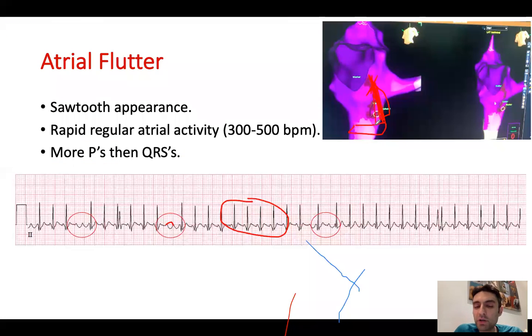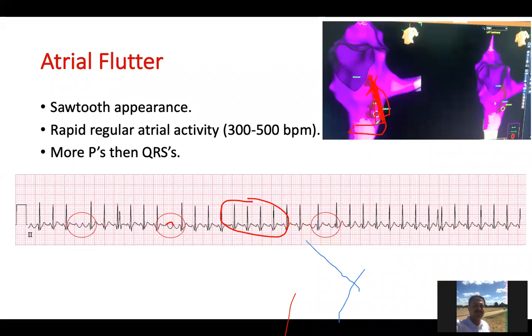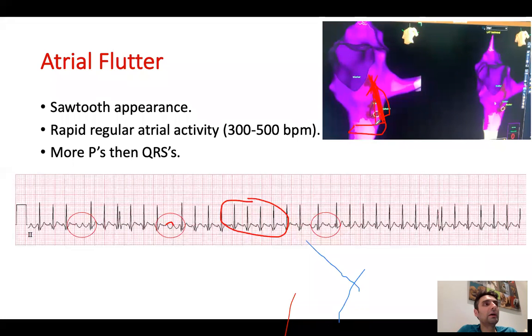And then, by the way, just to talk about this really quick, because again, this was meant for medical students. So atrial flutter in babies, the treatment is what, guys? Cardioversion. Hello, cardioversion. You cardiovert, and usually it stops, of course, and then it never comes back, except super duper rarely.